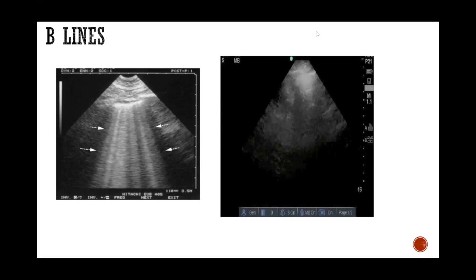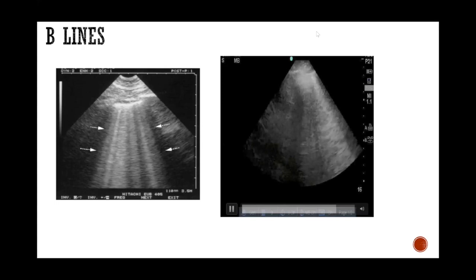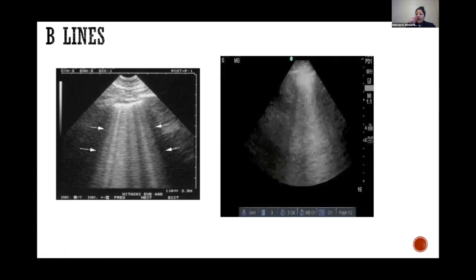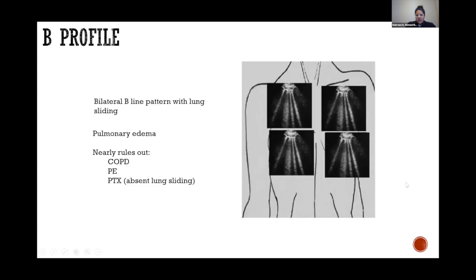Another question that we have is, they want to go over the signs of consolidation and ground glass in lungs on the ultrasound. Okay, great. And I see the question below that is actually relevant as well. It's something about thickened and irregular pleura referring to C lines. So I'll start with signs of consolidation and ground glass. Ground glass will actually look like B lines. It will look like confluent B lines, which I will show by forwarding to the COVID slide.